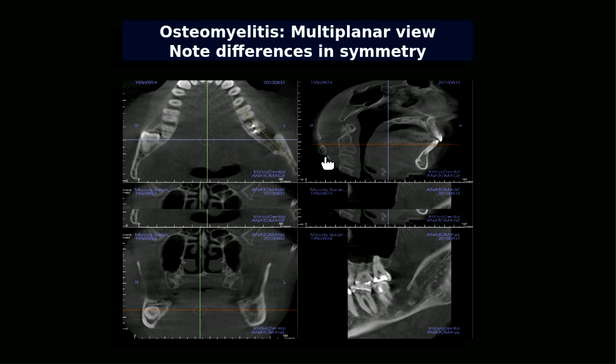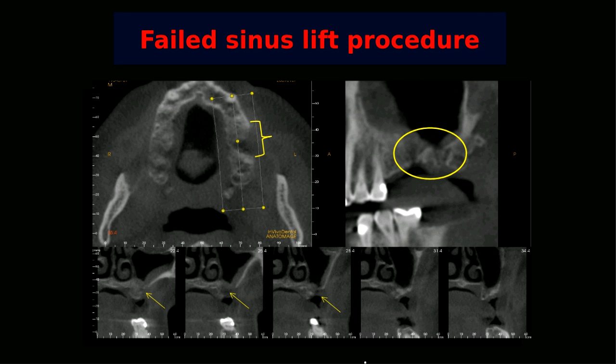And this is a case of a patient who underwent extraction and left it, and came after 3-4 months with a lot of pain. The patient said, actually, my left jaw is paining, it hurts a lot. When we looked, there was a pathological fracture in that area, because the sterilization and everything was not good, or the patient didn't take care of it. It broke, and there's a pathological fracture on the left mandible.